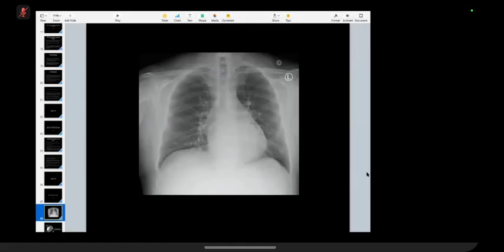So I'm presented with a frontal chest radiograph of a patient presenting with shortness of breath post-MI. There is calcification projected over the region of the left ventricular wall. In this context, I'm concerned that this may represent an aneurysm. I'm just looking at the remainder of the chest radiograph for features of left ventricular impairment. There are no pleural effusions, maybe some impression of slight upper lobe blood diversion, but no frank alveolar edema at this stage.